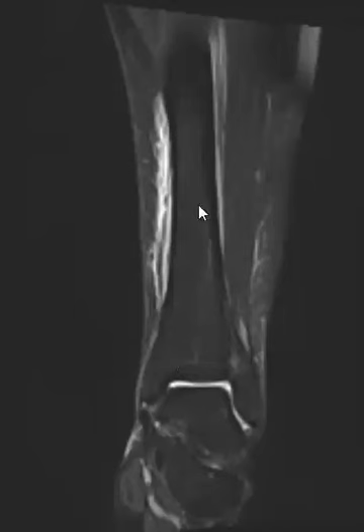It's a spectrum of injury along the anterior tibia. It can involve just the soft tissues at the low end of the spectrum, and then it can progress on to cause edema within the marrow. It can also cause edema within the cortex, and at the very latest stages, it can cause fractures. You see a horizontal fracture line. And another way to say tibial stress syndrome is just shin splints.